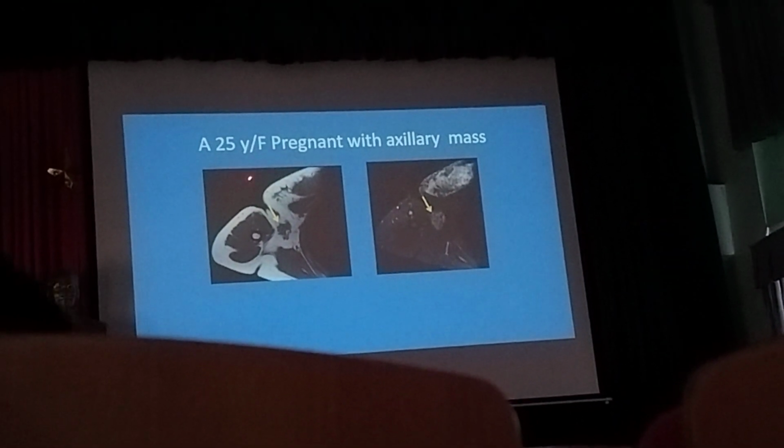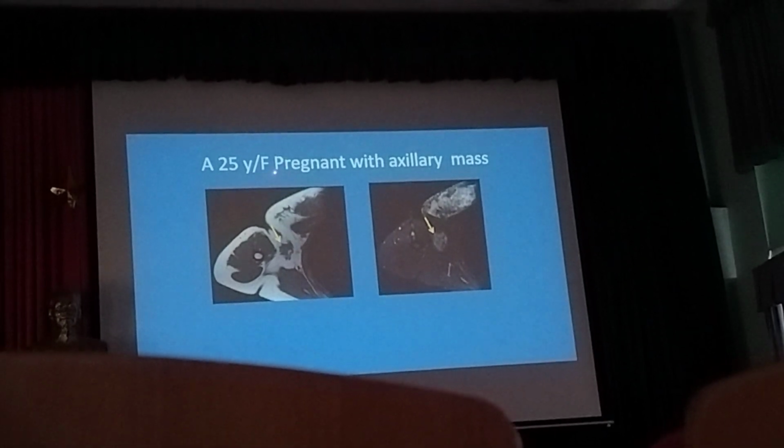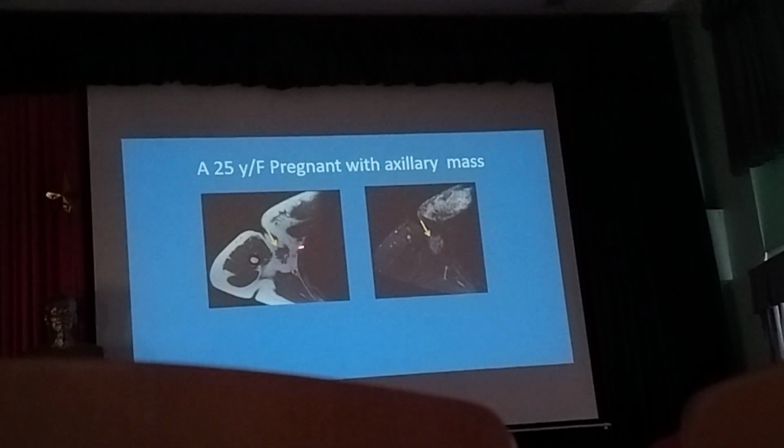Okay, so this one is the last case that I want to show you. That's a pregnant woman with an axillary mass, and the mass is here.